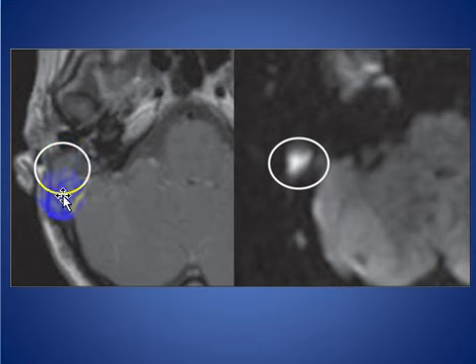And this patient also has non-enhancing soft tissue in the surgical bed of the right ear, with restricted diffusion, indicating that it is a recurrent cholesteatoma.